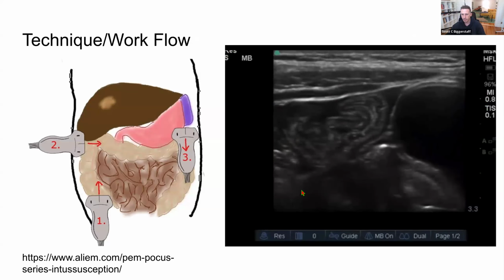Case 3, we've got an otherwise healthy 7-year-old girl with abdominal pain, nausea, and vomiting, mildly elevated temp and some tachycardia, white blood cells marginally elevated, but on exam, abdomen soft, non-distended. They are, however, tender in the right lower quadrant. And on admission, the appendicitis ultrasound was negative. So this patient had come in for observation just for fluids.